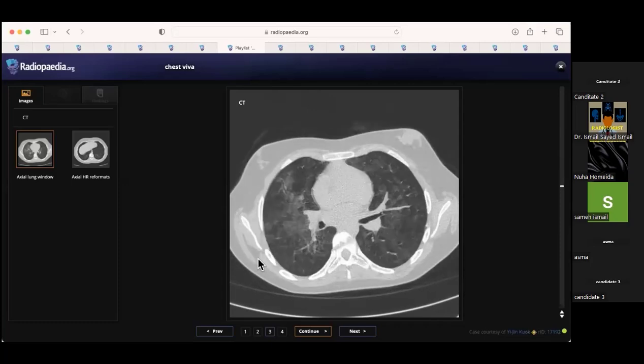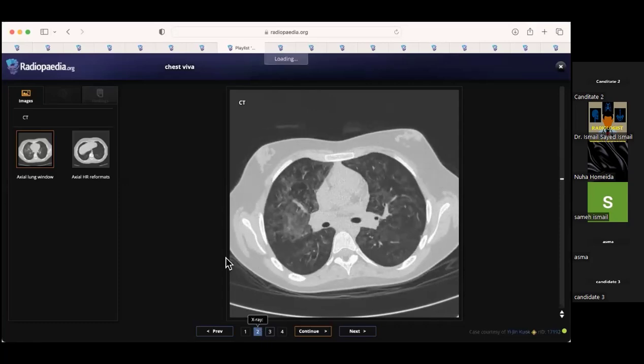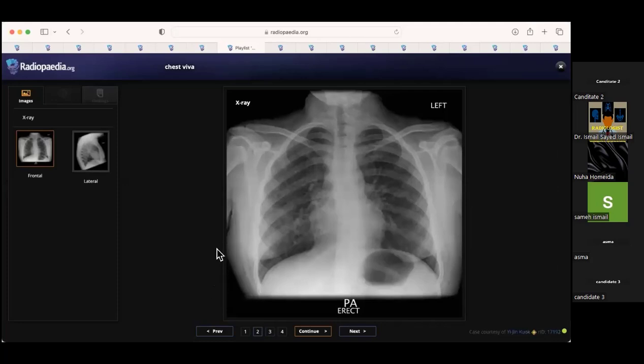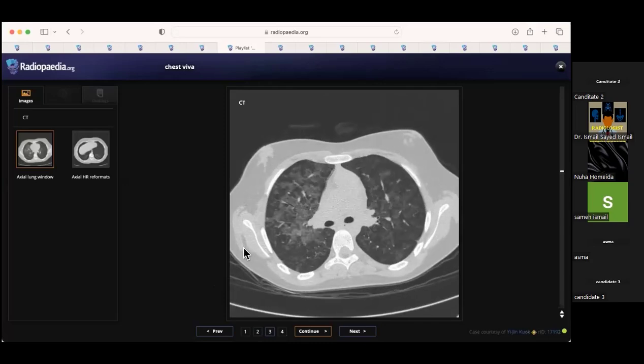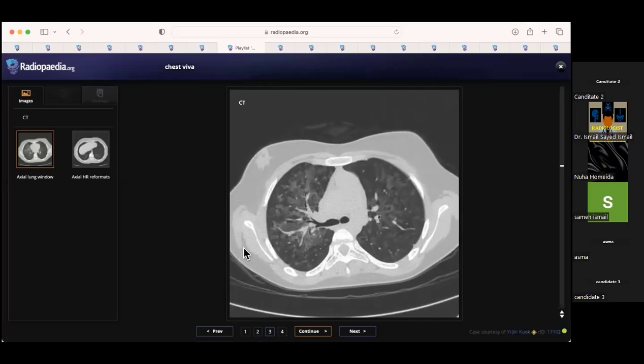Okay, yeah, so well done. You've picked it up nicely. So hypersensitivity pneumonitis does occur in pediatric patients. So that's a pediatric patient, and it's just an ill-defined alveolar infiltrate as you've described it. And the CT confirms that there is some air trapping and ground glass nodules.